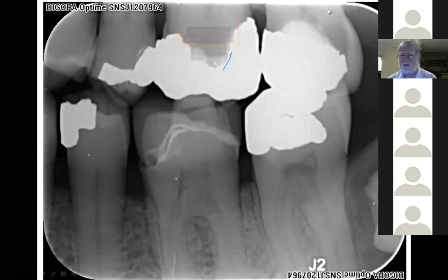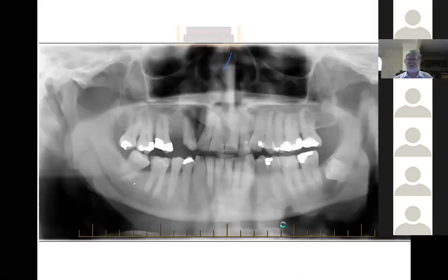More importantly. Okay, unerupted 8, right? Very good. And what would you do? Would you do any more investigation? OPG, very good. So let's do that. We're seeing this area here. I'm suspicious because the follicular space is enlarged all across there. We send the patient off for an OPG. What's going on? Very good. Dentigerous cyst is what it turned out to be. So one thing led to another.